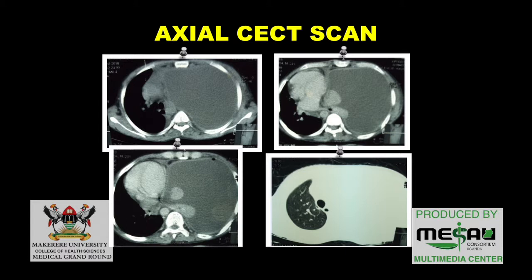And this is a homogeneous hypodense region. When we see such, we think this is fluid, from the Hounsfield units. We usually indicate them, and from this we get 25, which lies in between. Blood we usually give 40 to 50, water is 0, so it is in between there. So I could not appreciate whether it is blood or water. It could be blood, it could be water.